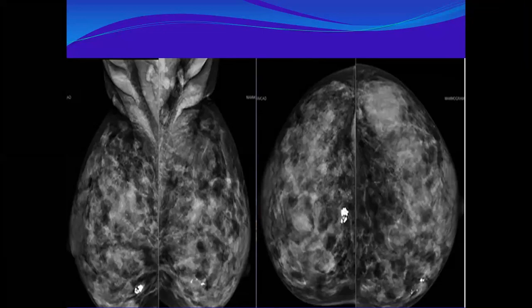Where? Start by laterality, right, left, then describe further. In the right breast. You are talking about these calcifications? No, outer. No, inner central.